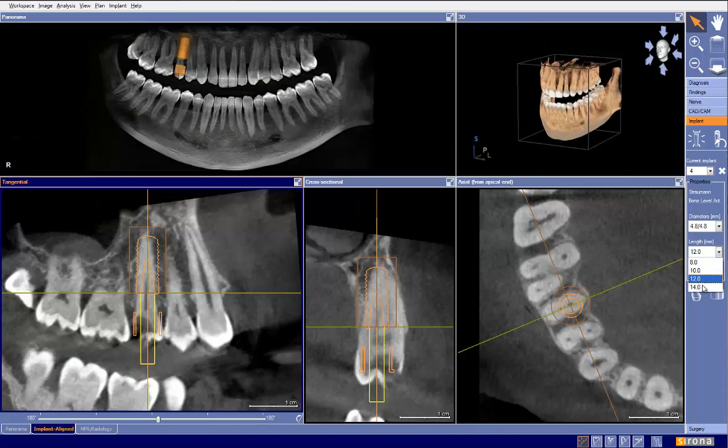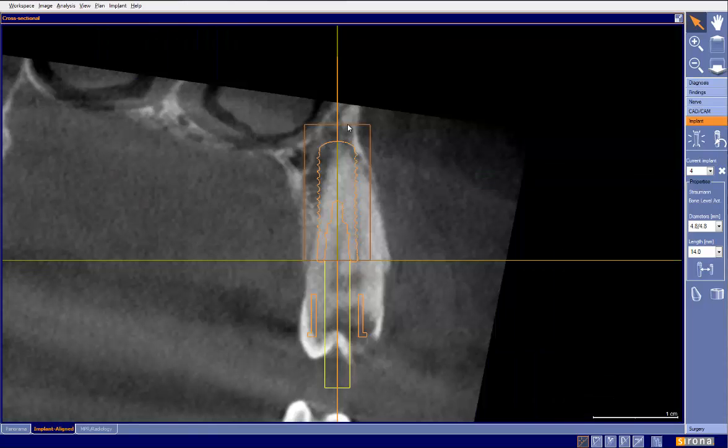So what I would look at is, can we go longer? Because when we go longer, now we're going to get more apical extension. We're going to have more bone on the buccal, so on the mesial here to engage. But now we bring into question this right here, this thinness that we're leaving. Now, is that too thin? Is that not thin enough?